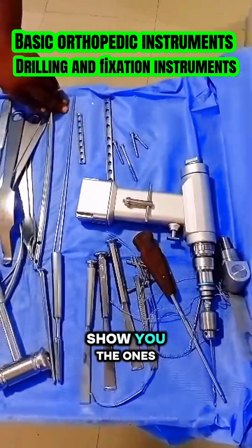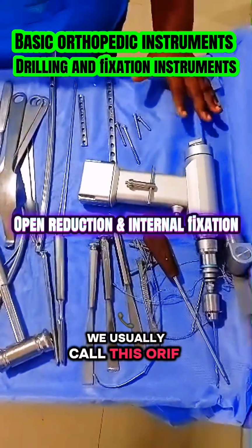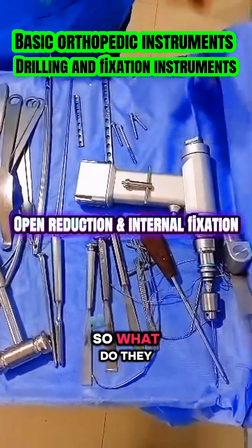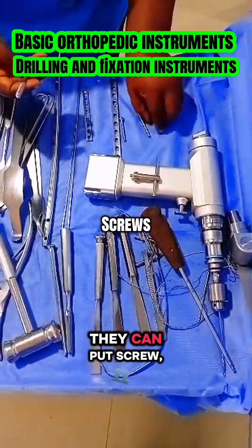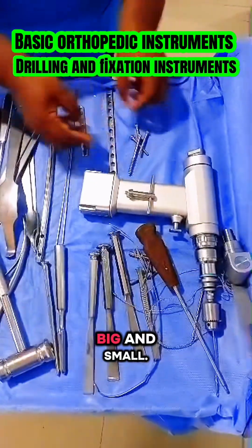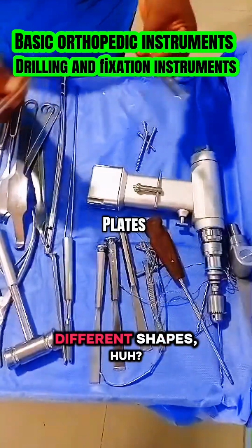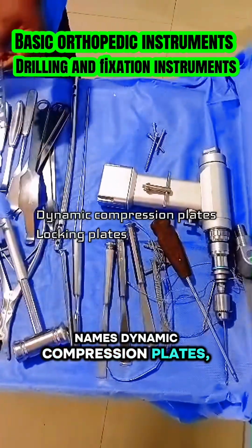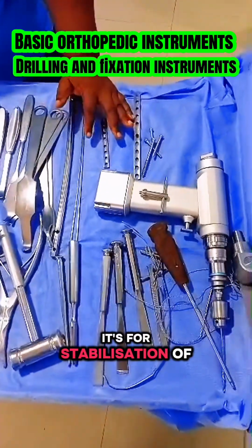So I want to show you the ones you can use for internal fixation. We usually call it ORIF. The doctors will do open reduction and internal fixation. So what do they put inside? They put screws. Look at it. They can put screws, which have different shapes, big and small. They can put plates. You have different sizes of plates, different shapes. They have their own names: dynamic compression plates, locking plates. They stabilize the bone. It's for stabilization of fractures.